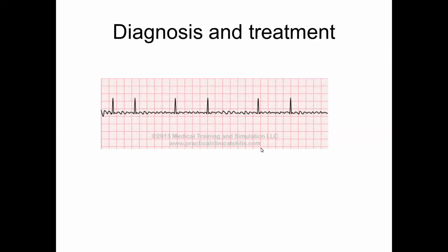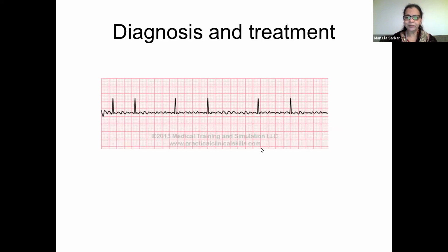It is flutter, sawtooth pattern. Are you sure this is flutter or atrial fibrillation? How are you going to differentiate between the two? The atrial rate is how much in flutter and how much in fibrillation?